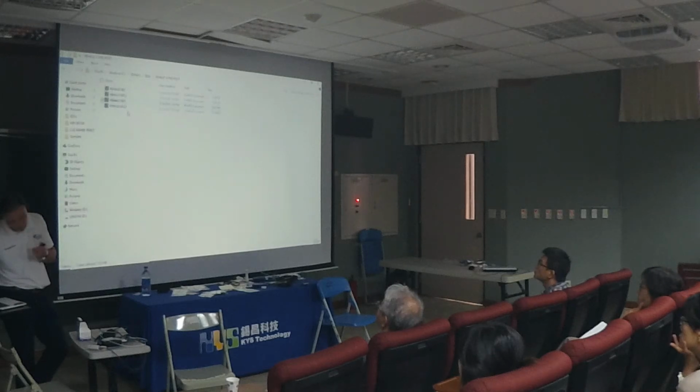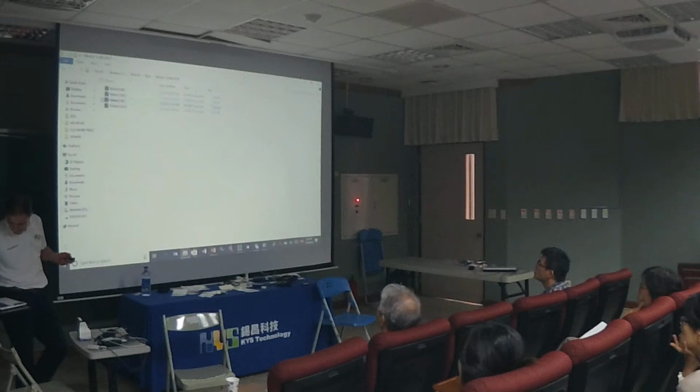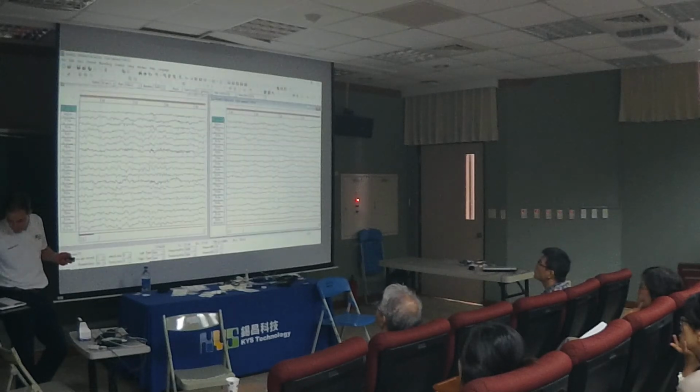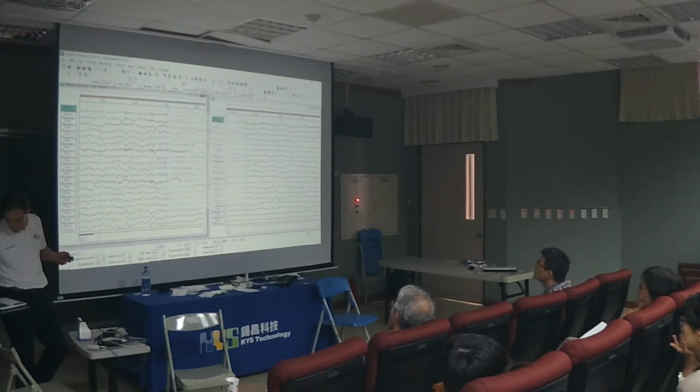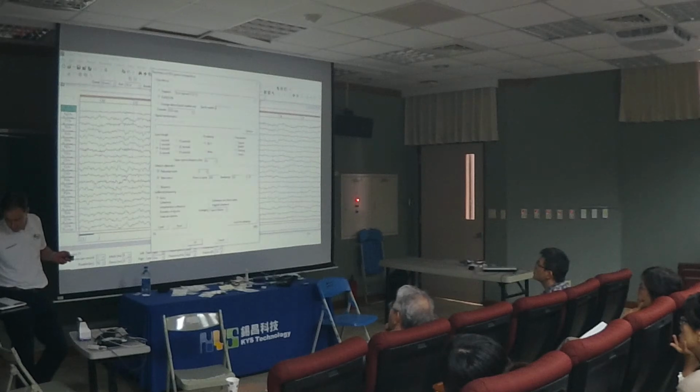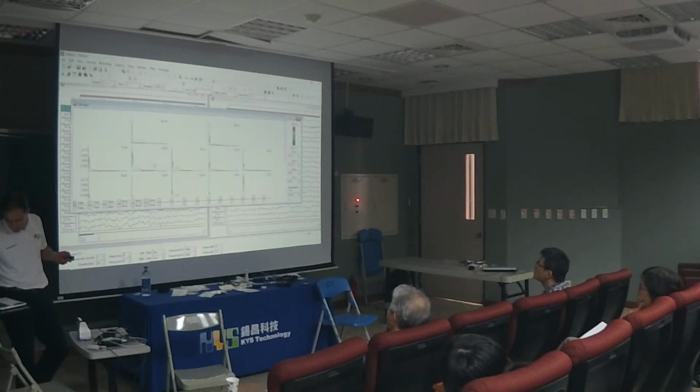And we can do a comparison. Let's go like this. So I'm going to go with analysis EEG spectra for this, and we're going to look at the midline on this one, okay?